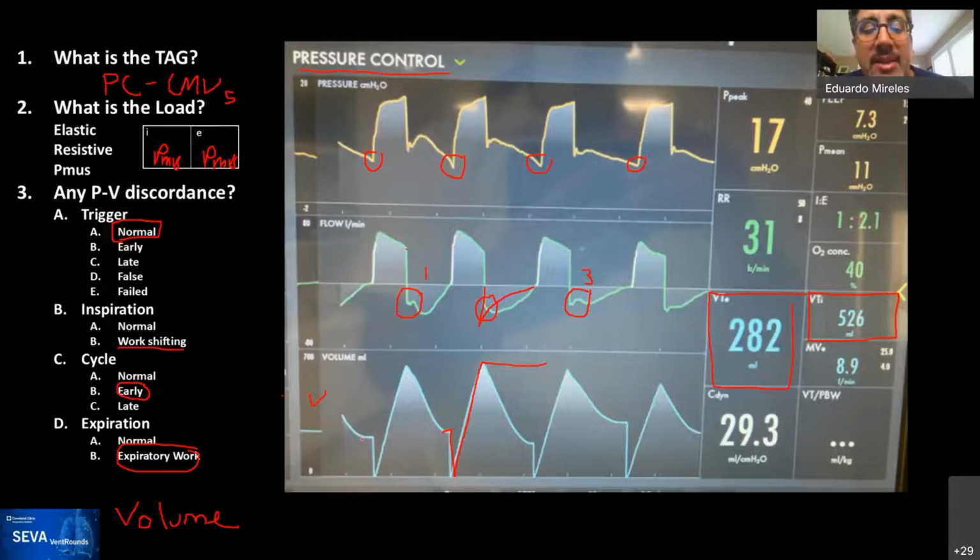As it has it, this patient actually has a constant BPF. It's one of our COVID patients with a constant leak, but he was waking up, he was starting to do effort on the ventilator. And I think that's what's causing the variability in the amount of the leak, the presence of effort during the breathing is just changing the thoracic pressures.